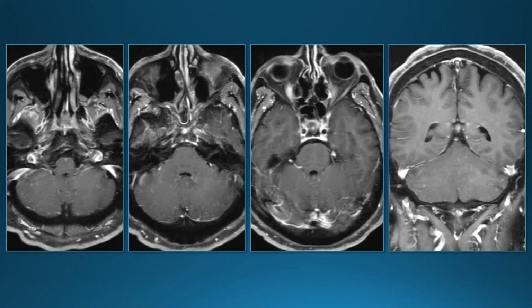We had some post-contrast images, and it's a little subtle here, but you can see these little dots in the cerebellum, on the surface of the cerebellum. I believe these are areas of leptomeningeal enhancement. You can see some here, right on the surface of the cerebellum. So these are areas of cerebellar leptomeningeal enhancement. Leptomeningeal enhancement is not at all common with MS. You can see enhancement within the acute plaques, but not leptomeningeal enhancement.